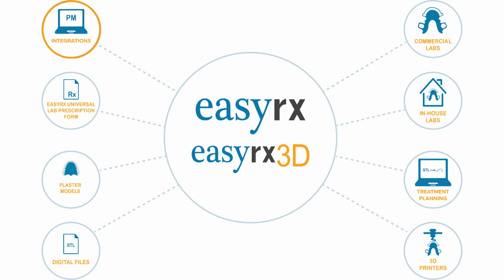EasyRx integrates with practice management software products, making your workflow seamless. Use the EasyRx Universal Lab Prescription Form to create all your lab, clear aligner, and digital prescriptions through one form. Submit cases to labs with traditional plaster models or impressions, or attach digital files directly to the prescription to send to your labs. With EasyRx, you can submit cases to your commercial labs or your in-house lab.